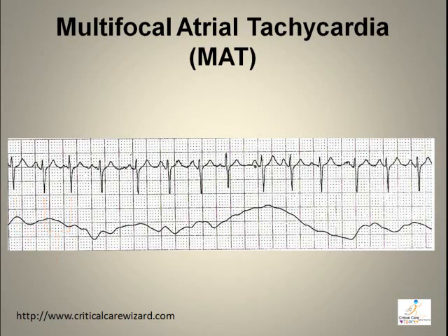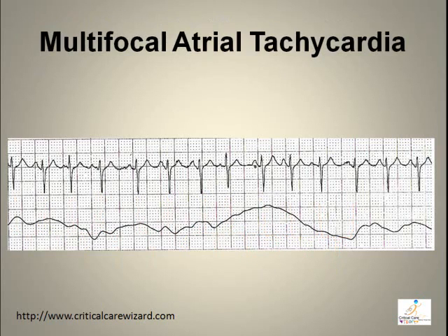Multifocal atrial tachycardia, or MAT, rhythm is irregular. MAT P wave shape or morphology is non-consistent.